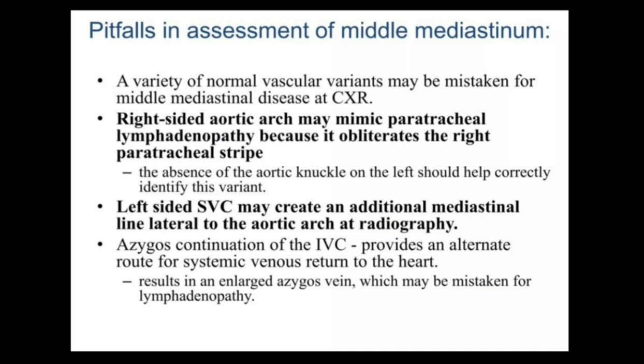There are a few pitfalls in the assessment of the middle mediastinum. A few of the normal vascular variants may be mistaken for middle mediastinal disease at X-ray. Right-sided aortic arch is one such cause, and left-sided SVC.